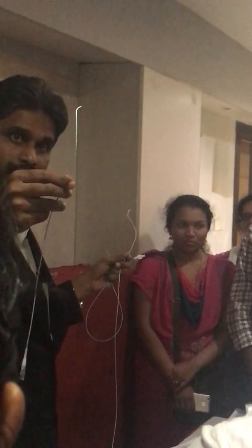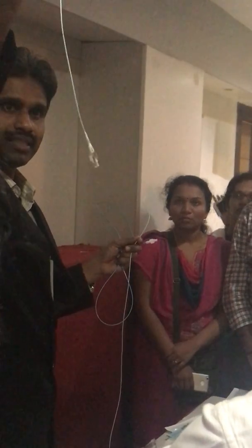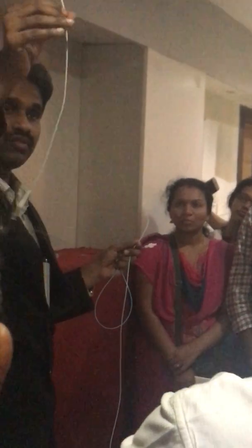So what is this one? Simply, people may not keep it. This is called the Kumpe, which is very short. See, it's very short. Where is it used? This is generally not used for angio. The Kumpe is used in biliary interventions. Okay.